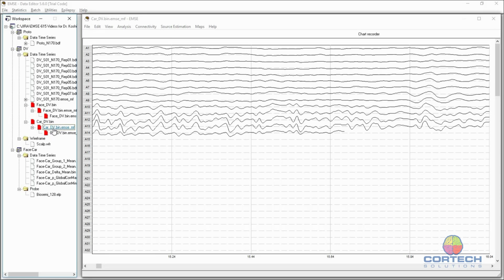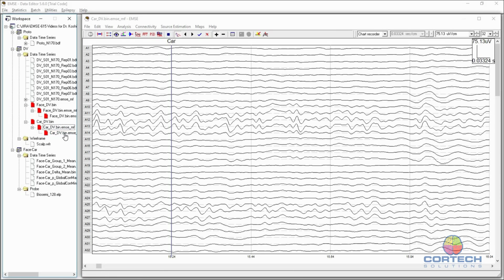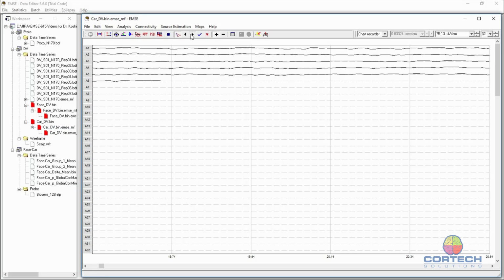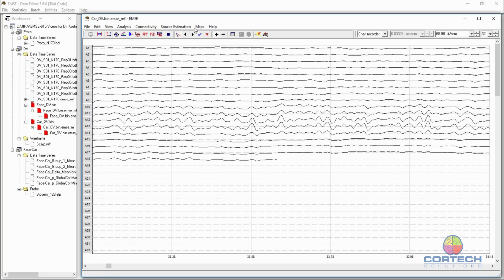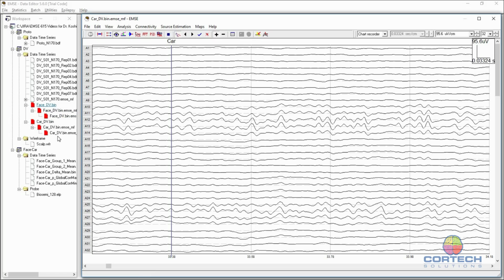So now the car average also has a metafile which points to all the single trials. Okay, last time we used these two metafiles to perform a permutation test of the differences between face and car. And this time let's look at the one condition test.